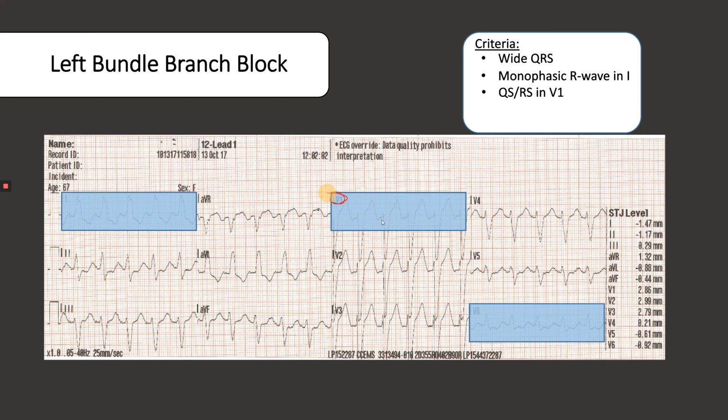Starting at the very beginning of the QRS, drawing that isoelectric line right along here, a QS wave, if you guys remember from way back when, is this: if this is the isoelectric line, it goes down, back up, and ends. And that's it. That's a QS wave. You can have some elevation to it, whatever, but that would be defined as a QS wave because I only have a downward deflection. I don't have an upward deflection at all.